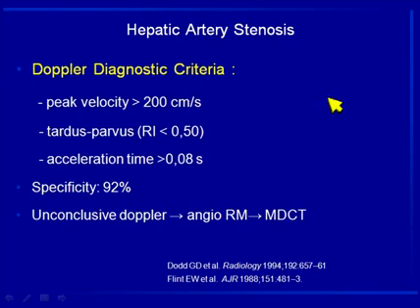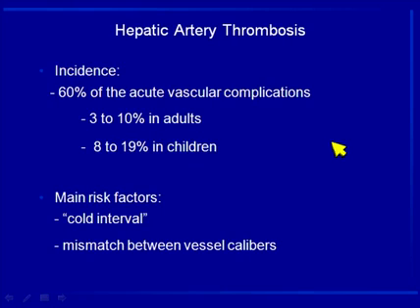Doppler diagnostic criteria: peak velocity more than 200, tardus parvus aspect of the flow, acceleration time more than 0.08 seconds, and in cases of inconclusive Doppler, we can follow with angio-MRI or CT.